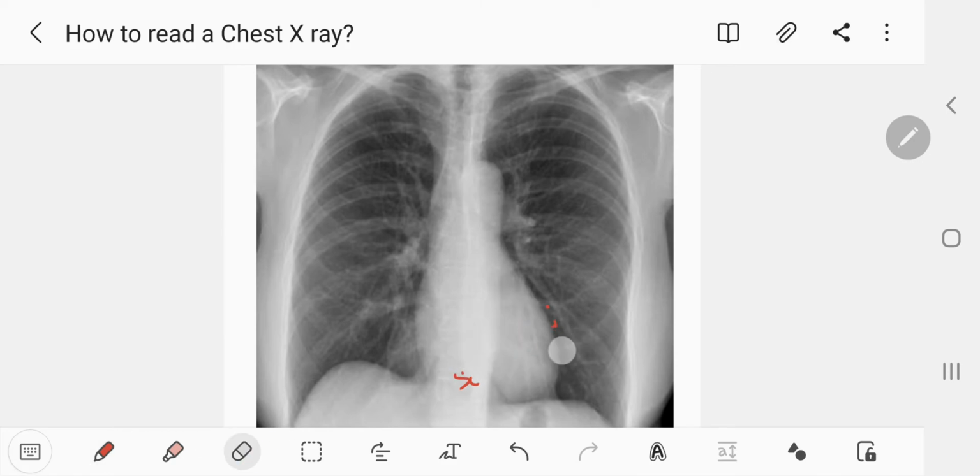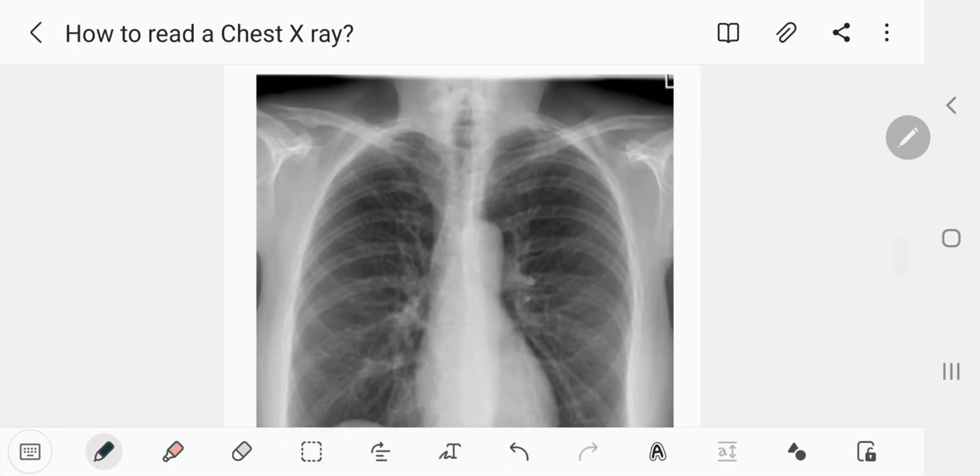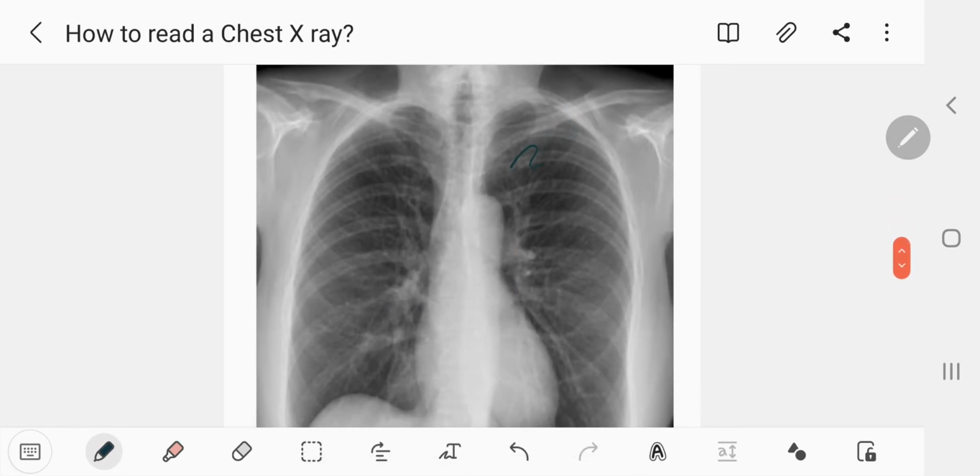So in this way you can very easily say that the big one over here, starting from the middle onwards, is actually the posterior rib, and when this posterior rib takes a turn over here, it ends here. So this direction is the anterior rib, and this direction is the posterior rib.